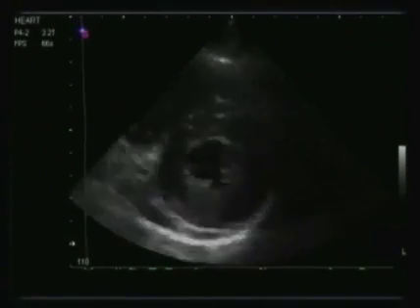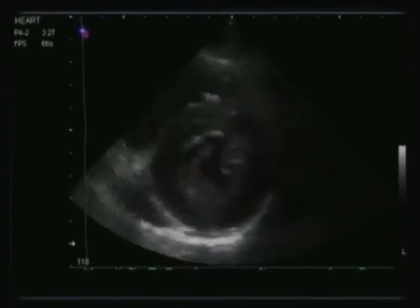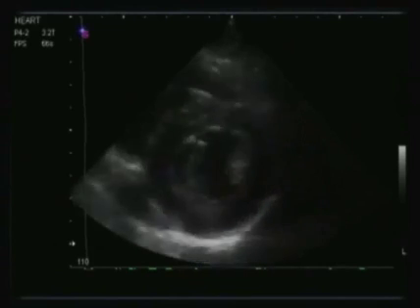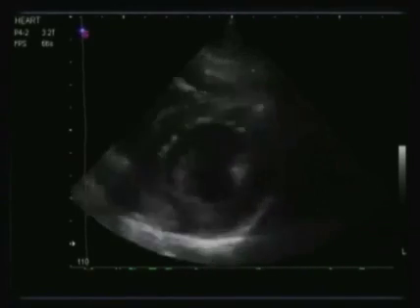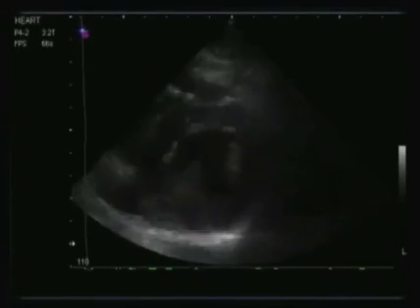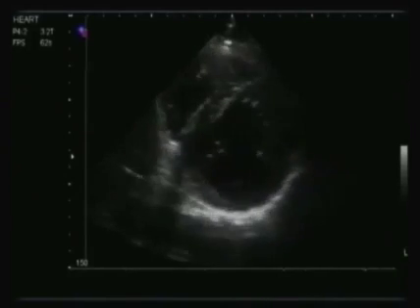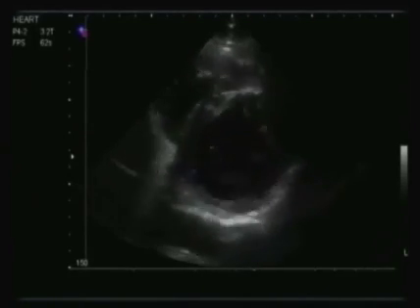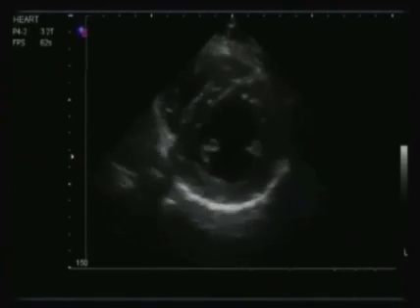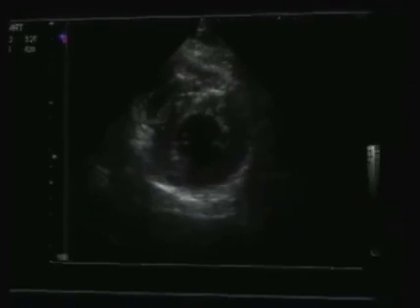Short axis is a good way to learn this. So, if you focus on this left ventricle and look at the percentage of change in volume that occurs from end of diastole to end of systole, you see that there's a very, very large amount of squeeze. It's almost in the range of 80%. Look at another example, also good symmetrical squeeze in this left ventricle, not quite as much as the last example, and this one is probably estimated about 60 to 65%, so just a normal ejection fraction.